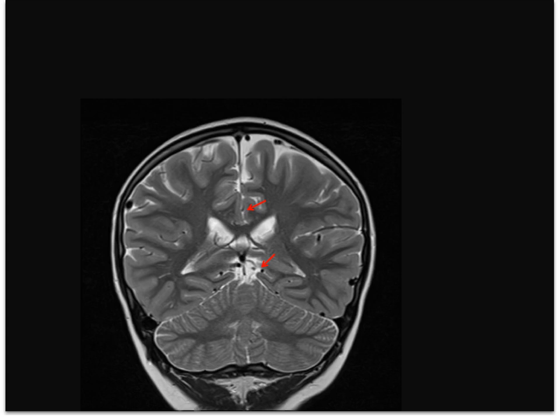When the cingulate gyrus courses around the back of the splenium and just goes under the splenium, its name is changed to isthmus of cingulate gyrus, and then progressing anteriorly and laterally, it is changed in name to the parahippocampal gyrus, which we already have seen. Lingual gyrus of occipital lobe is named for this tongue-like configuration we can recognize on this image. Its relationship with the parahippocampal gyrus also is nicely demonstrated in the sagittal images.